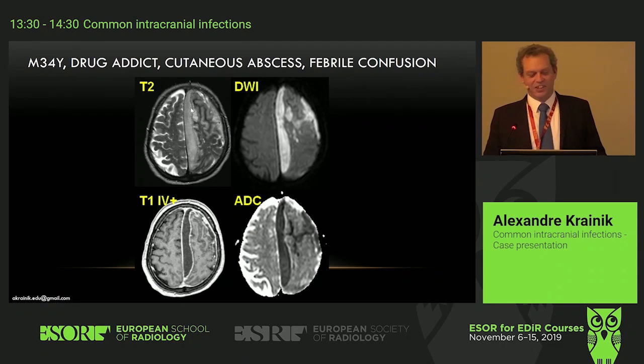Okay, T2, it's not that dark. Okay, T1, it's not that bright, but you have restricted diffusion. DWI hyperintensity due to a restriction of diffusion. That's right.